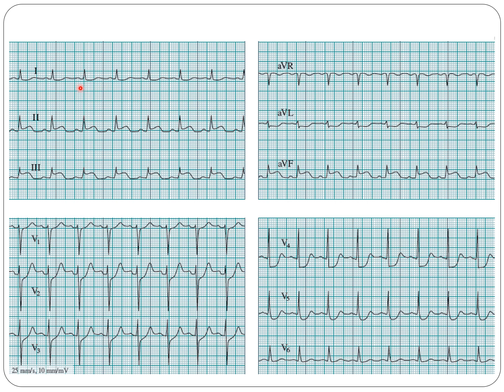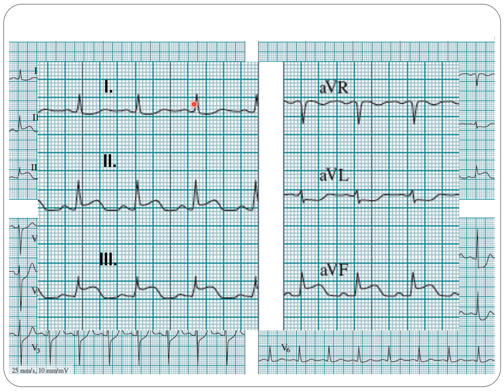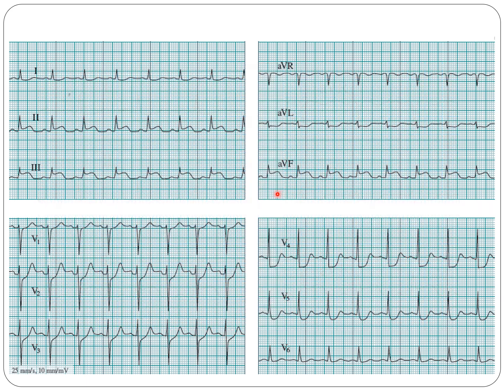Again, this ECG is rhythmic. The heart rate around 90. P is sinus, PR is normal, QRS is narrow, axis around 60 degrees because in AVL we do have the biphasic leads.